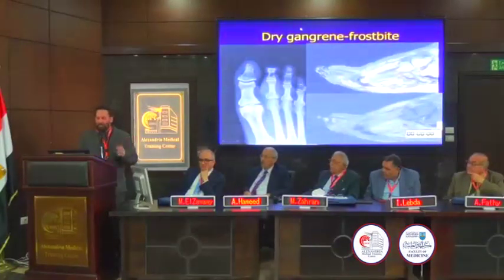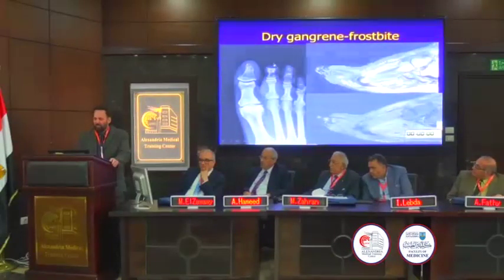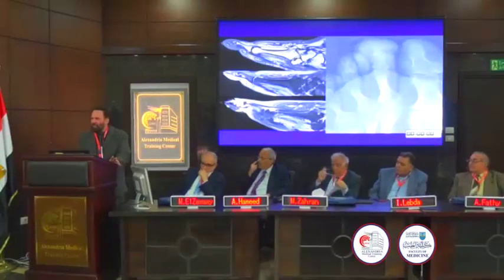I told you, you see a lot of frostbite in Detroit. You see the loss of soft tissue, and you see the little gas. Do you see a little gas? Yes? And you see the lack of enhancement? Stops here. And this is now dry gangrene from ischemia, from frostbite. Another case of dry gangrene, but you see the changes in the bone? But the changes look odd. They don't look like osteo. They're more complex, more heterogeneous. Can you see that? And both dry and wet gangrene, when you get changes in bone, the bone is infarcted.